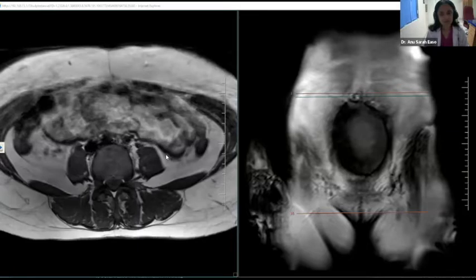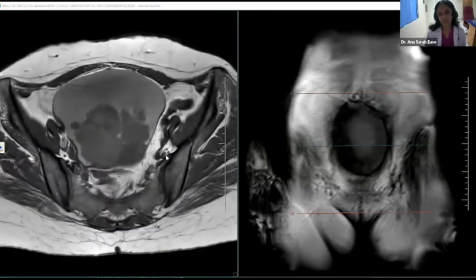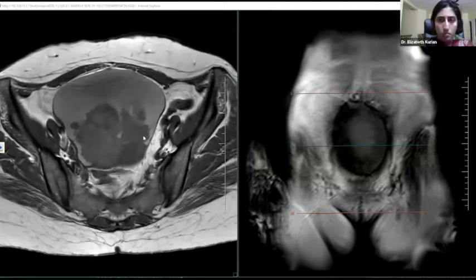So this is a 50-year-old lady who came with a mass in the abdomen. She felt that there's abdominal protrusion, and then she underwent an ultrasound scan and then further evaluated with MRI. So I'm sharing the MRI images. So PGs can see. I'll scroll from here, and okay, ma'am. You can see and you can describe the findings.